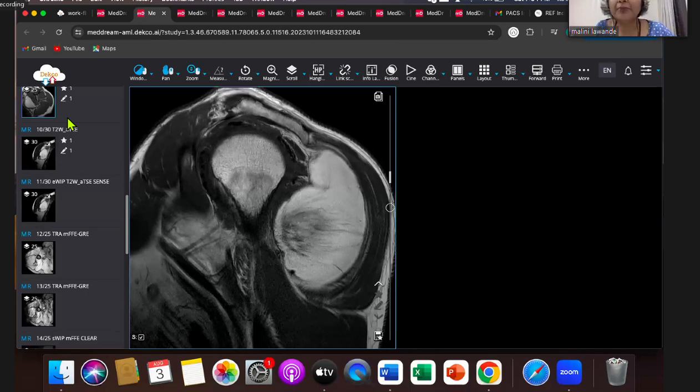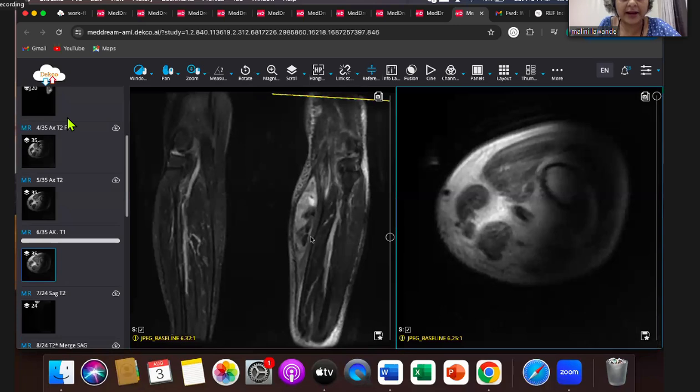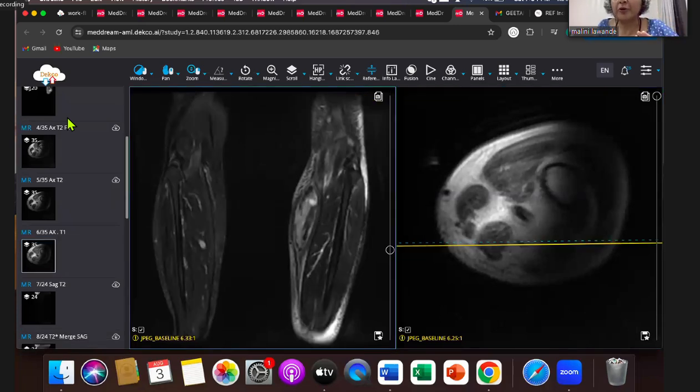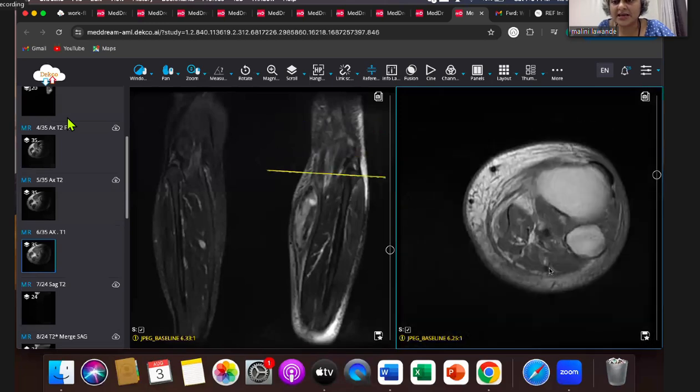Another case I had opened, but I'm not able to find right now, was fibromatosis, where the whole lesion is dark on T1 and T2 weighted image. Let me just see. Okay, let me end with this particular last case. Let's look at this and then we can end. Yeah, so this is not fibromatosis. That case I'm not seeing. The posterior chest wall lesion was myositis ossificans. The questions I'll just answer. Let's look at this last case.